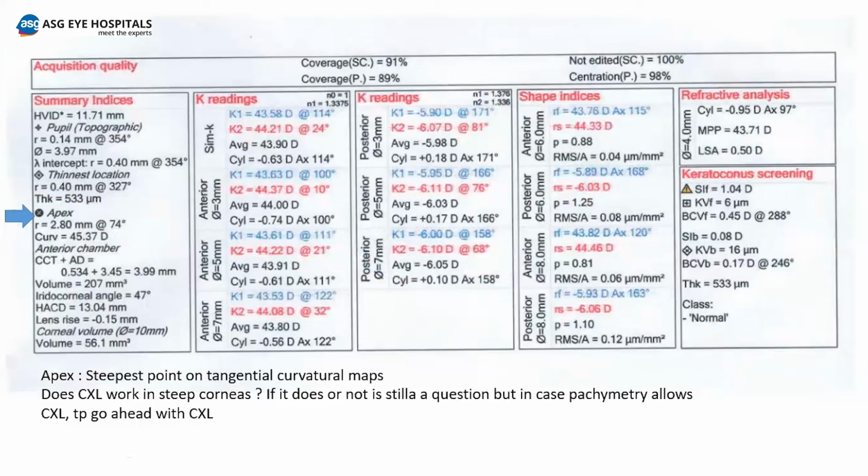Of course, these are rough guidelines because the algorithms of the two are different. So it has been found that a 0.7 diopter difference and a 10 micron difference comes between Pentacam and Sirius. So Kmax is nearly the same. Thinnest pachy also nearly 480 as the cutoff, and the y-axis of the pachy, or the temporalization of the pachy point, we can again, as ma'am described, check from the Cartesian coordinate.